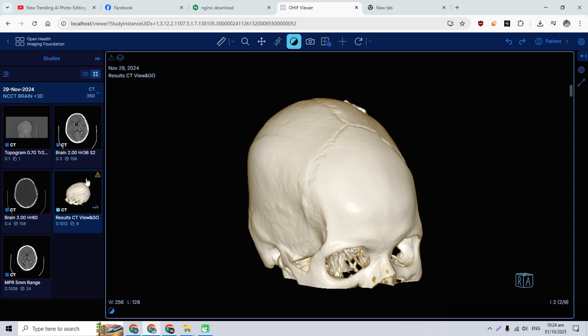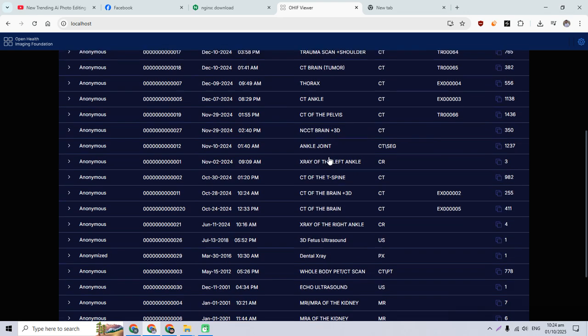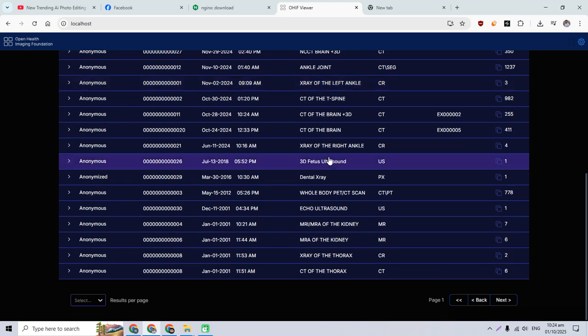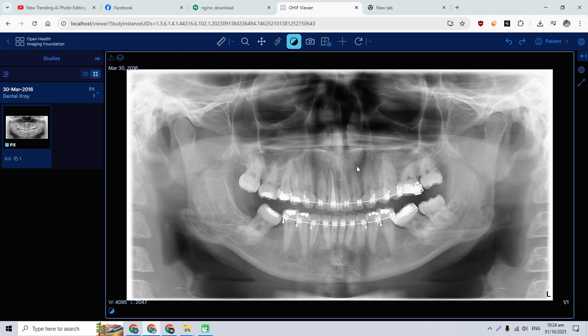So like it, we can also check other things, like the dental X-ray. This is the dental X-rays video. Okay, we have to wait until it is launched.